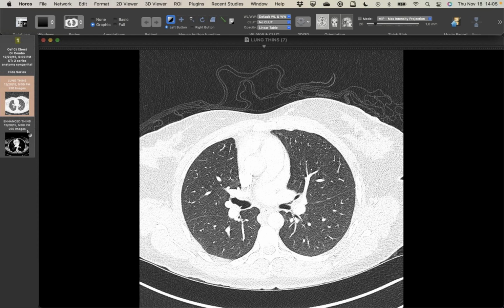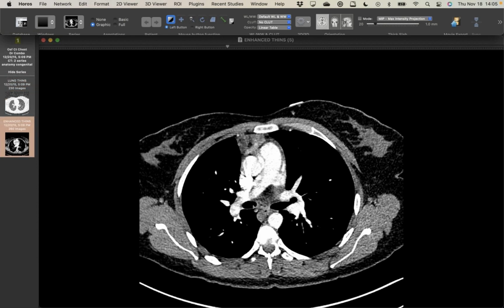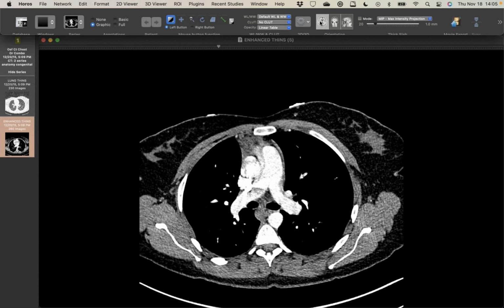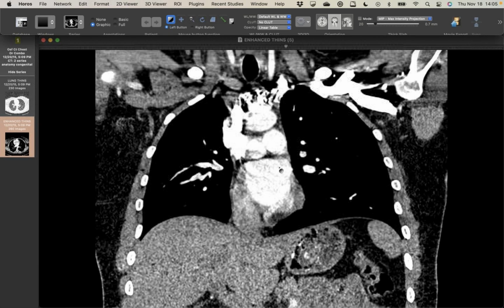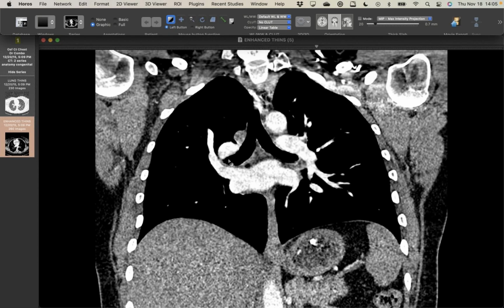I'll show the vasculature here. You can see there's the arteries. So these are hyparterial bronchi there, and we can make a coronal. And you can see that indeed this patient has bilateral hyparterial bronchi. So this is an incidental case of left pulmonary isomerism.